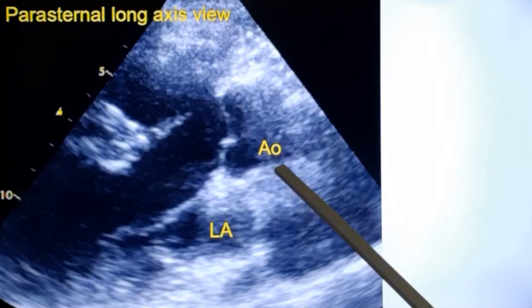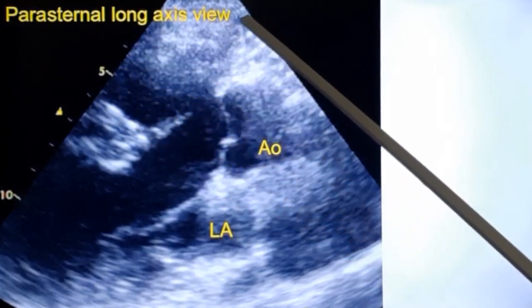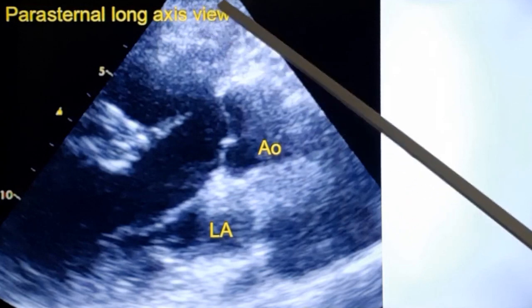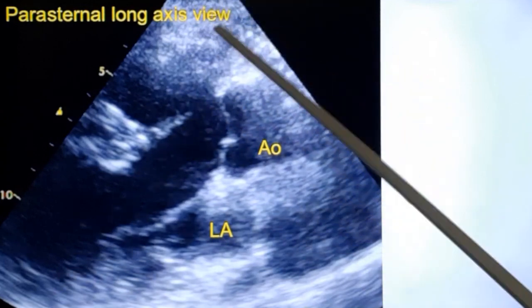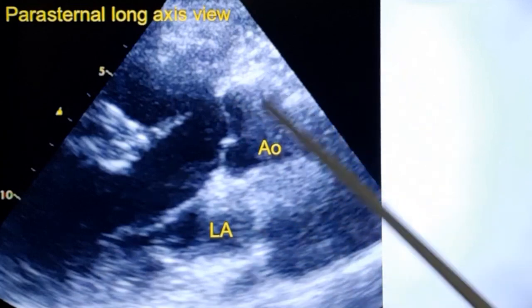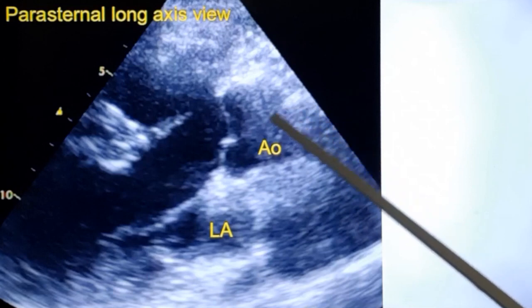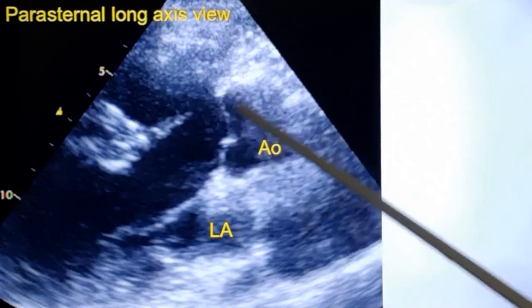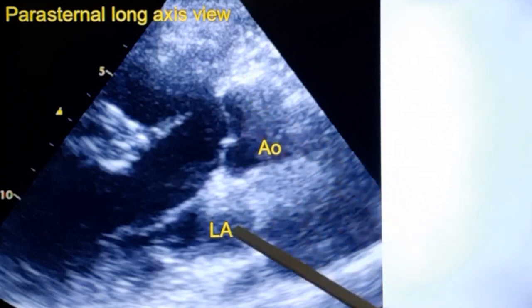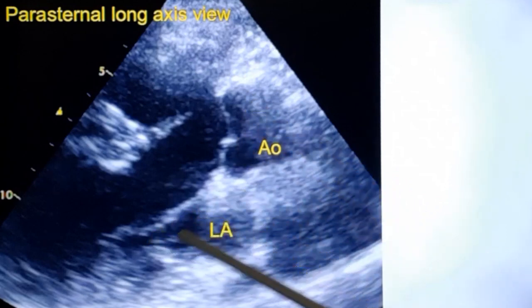This is an echocardiographic image from the parasternal long axis view. This is the location of the transducer and this is the sector scan. You can see the two-dimensional sector imaging from an echocardiogram. And I have marked out the aorta. This is the aortic valve in closed position. And the mitral valve also appears to be closed.